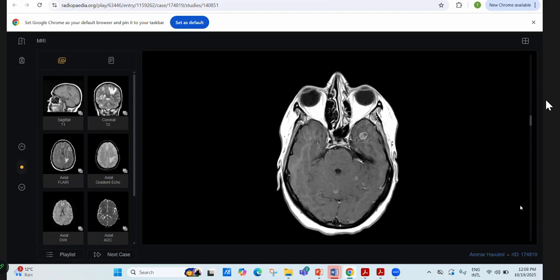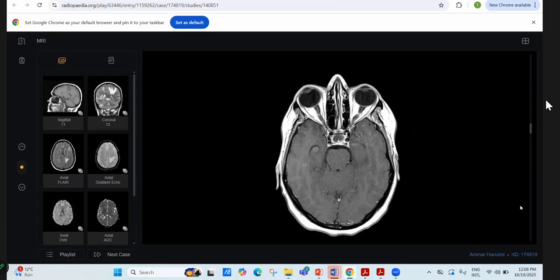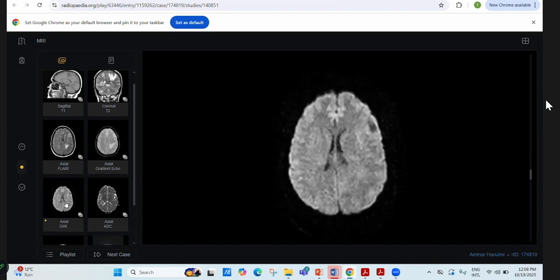The patient should have a staging CT thorax as well, but the patient is already in stage 4. I would also like to see the diffusion restriction for these lesions. Why? If these are ring enhancing lesions, keeping in view the history of positive carcinoma breast, ideally these should not be reflecting diffusion restriction, versus granulomas or abscesses. When we compare, we can rule out the possibility of abscess.